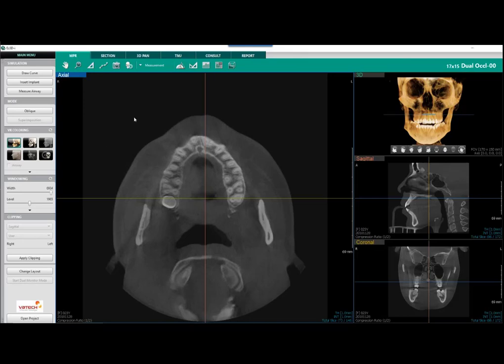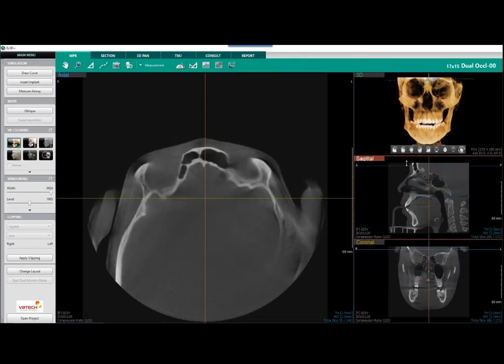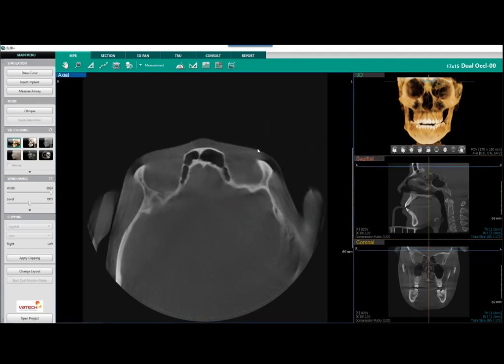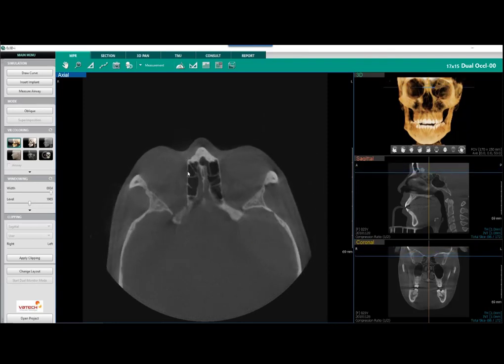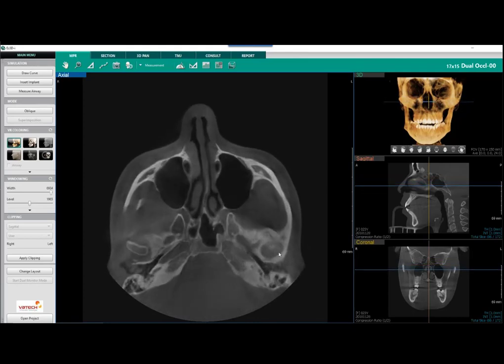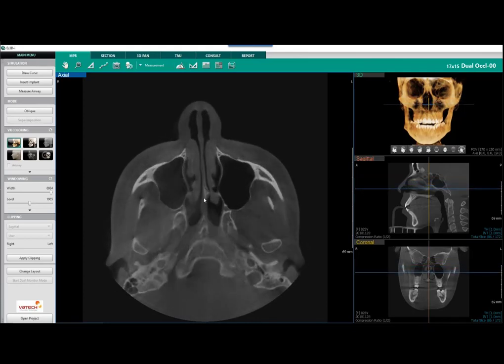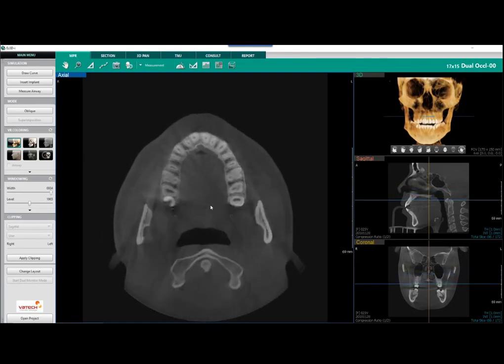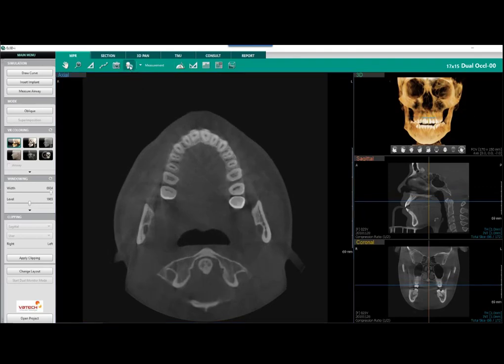Paul, I think right now it might be a good time to jump over to our 3D pan view. Yeah, for workflow, what we did in the beginning, I enlarged my axial slice. I'm going to drag my axial slice to the superior border of the scan. Paul talked about hitting the space bar, and now we're going to scroll down, identifying our anatomy, our orbits, going through our sinuses, our condyles over here, external auditory meatus, nasal concha, hard palate, and really just scrolling through that to give us an overall view, a starting point.